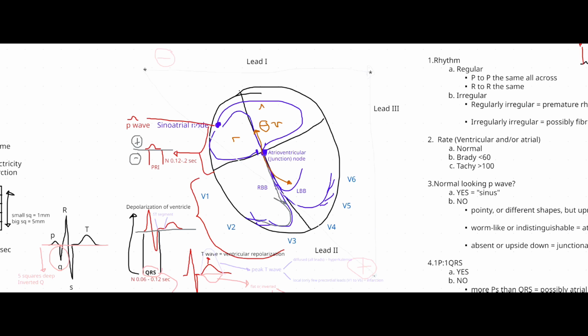I've never seen that. Because again, Q usually is for scar tissue. Yeah, but so that's your Q. Okay, now here's the other thing. You may not see this as... hold on, let me just finish my thought. So you might even see it like this, right? And then here's your T, and on top of your T, you might see a little knob like that. That's your P.